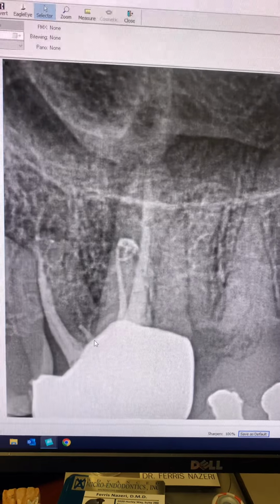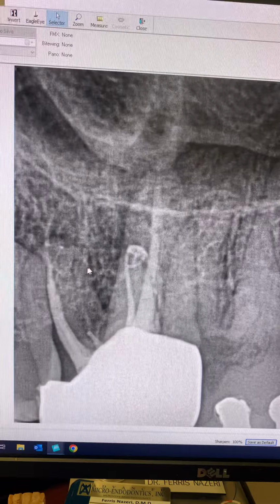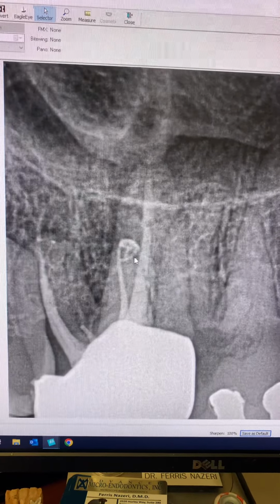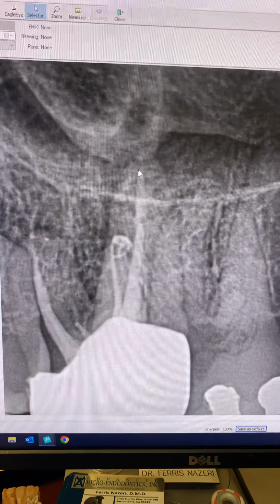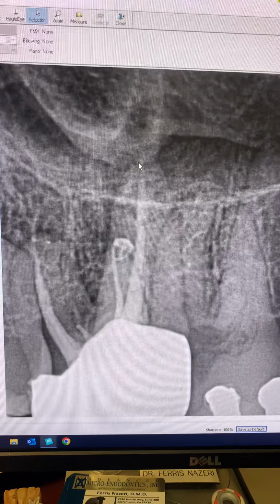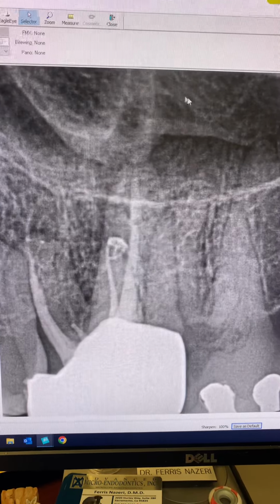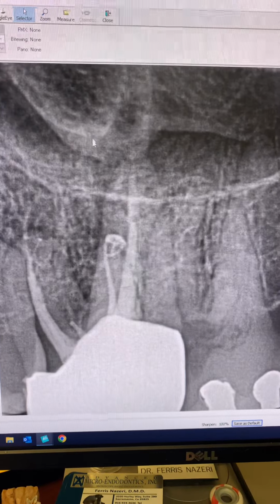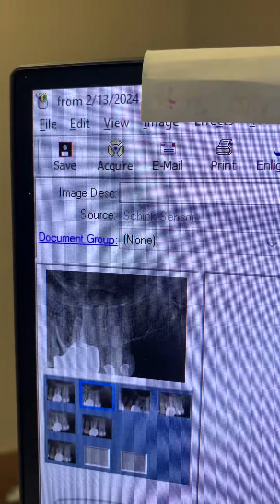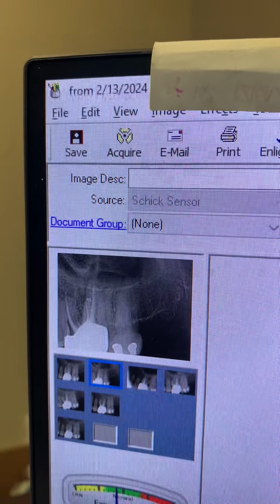So the underfilling of the mesial canals, the overextended gutta percha there, perhaps maybe my MTA didn't go all the way to working length as much as I wanted it. But again, you can see that large periapical lucency there. Yeah, how big that was. And again, that was immediately after we went through the crown and did this root canal for this patient in one appointment.